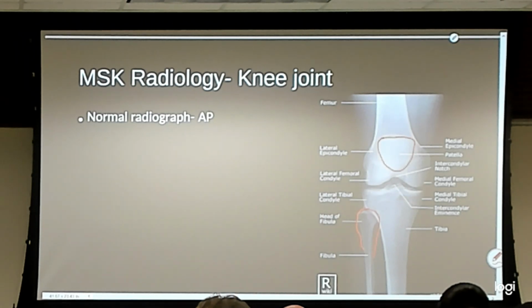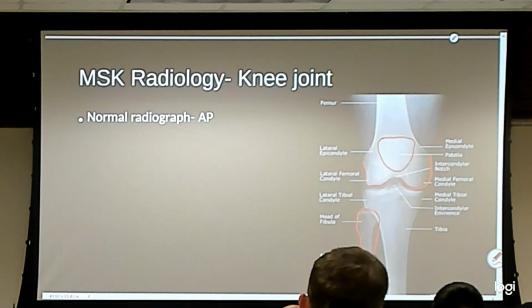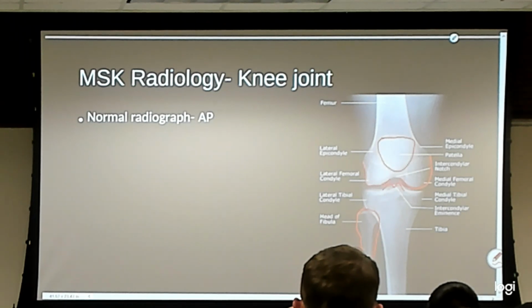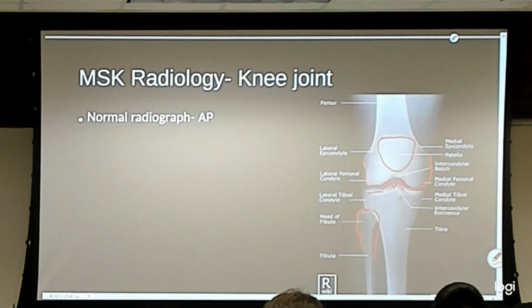Medial femoral condyle. Now that I've identified lateral, I can identify my medial condyle and my lateral condyle. Here, these 2 mountains in the middle are our tibial spines. And then a phrase that we will use more next block, but it's kind of important to understand now, is these flat surfaces at the top are the tibial plateau.